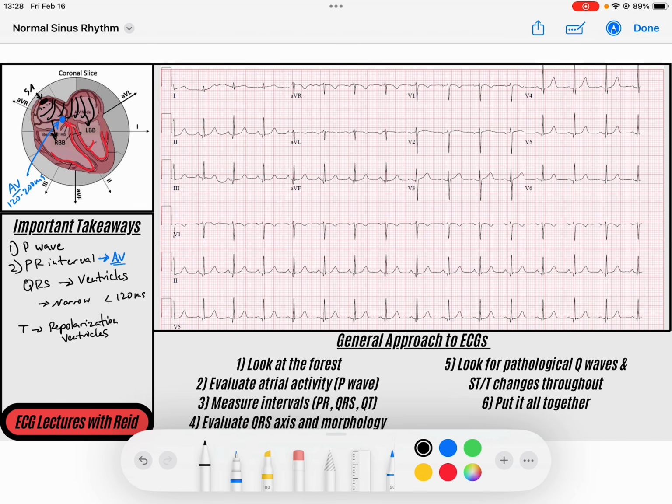And so based on this order of operations, we see typically with each complex, each ventricular contraction of the heart, we will have at first the P wave, because the atria contract first. Then we have a little bit of pause. Then we have our QRS complex representing ventricular depolarization. Then we will see after it our T wave for our ventricular repolarization. And so that tells us that there is some type of organization of our cardiac electrical activity.